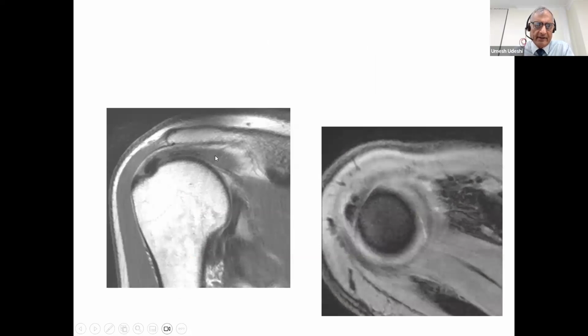Now, this particular scan, so here's the tendon. Now, actually, most of the tendon looks gray, apart from this small splodgy bit here, which is black. And then on the axial image through that, transverse image through that, we see two black spotty areas. But they're really rather low signal, really rather dark. So that should be raising suspicion that there's calcification in this tendon.